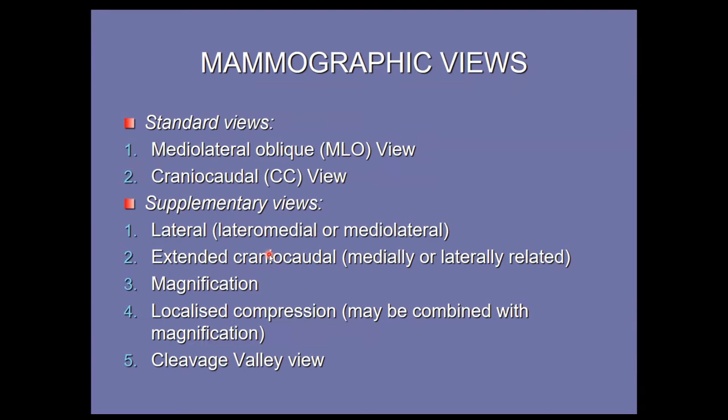Supplementary views means, as all of you can understand from the word supplement, they are additional or additive views which help us in making our diagnosis. So number one, lateral. This is a true lateral view, lateromedial or mediolateral. Extended craniocaudal, medially or laterally rotated.